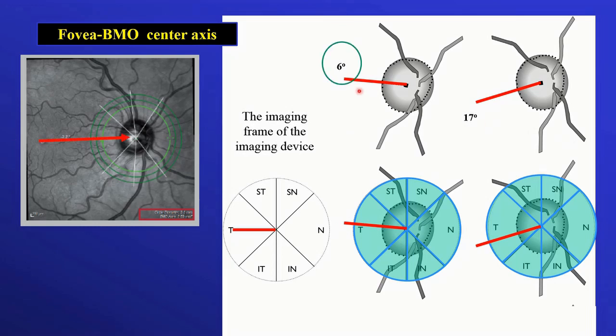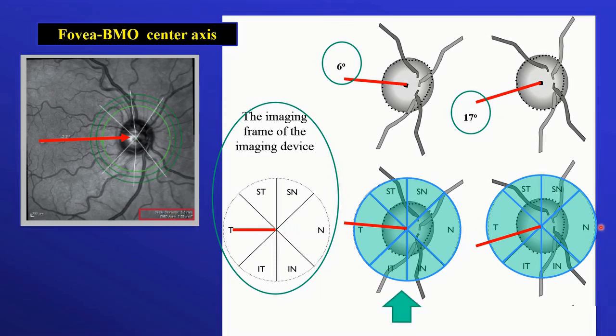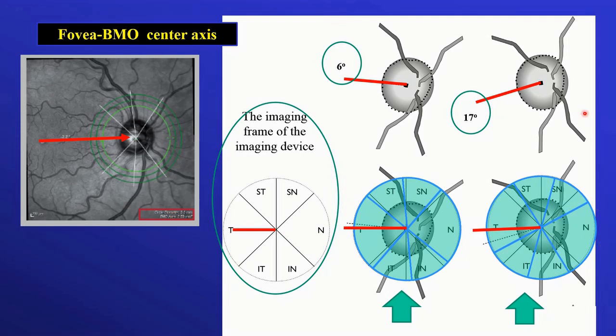So in this example, it is up. In this example, it is down. This is the perfect location, 100% horizontal. Then the software will start to rotate the image, as here also, to be directly horizontal. This is an advantage because sometimes this rotation, this deviation is large, and this will affect the relation between what we see on the OCT compared to that of the field.